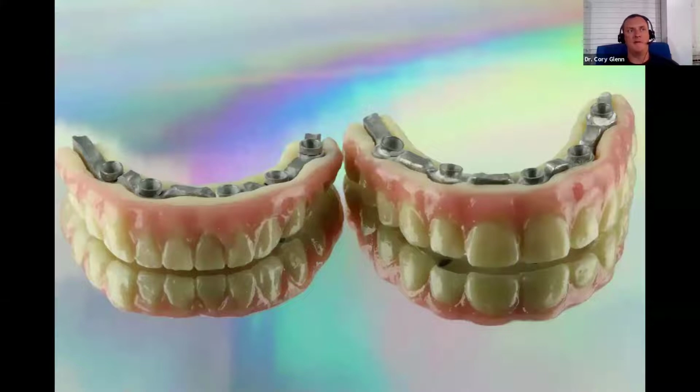A thing to be aware of with the Form 3B is that there's a different build plate that you're supposed to use for these resins. So if you're using the permanent crown and bridge resin, there's a stainless steel build plate. And I'm not 100% sure on this, but as I understand it, apparently these resins, because they have so much filler in them, they can actually abrade away an aluminum build plate, which is what most of them are. And so you need the stainless steel one for it to hold up in the long term of using this. But yeah, I've not really had any issues with that.